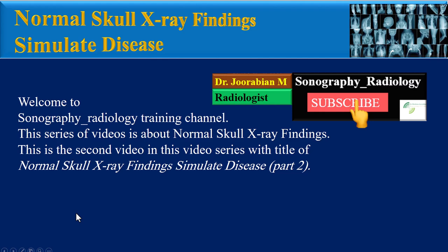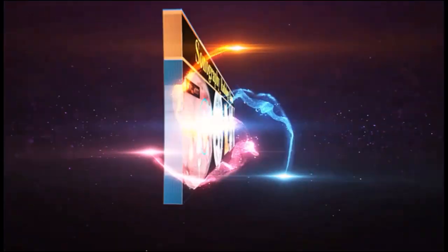This series of videos is about normal skull X-ray findings. This is the second video in this series, titled Normal Skull X-ray Findings That Simulate Disease, Part 2. Like video part 1, we will review a few cases of normal skull X-ray findings together.